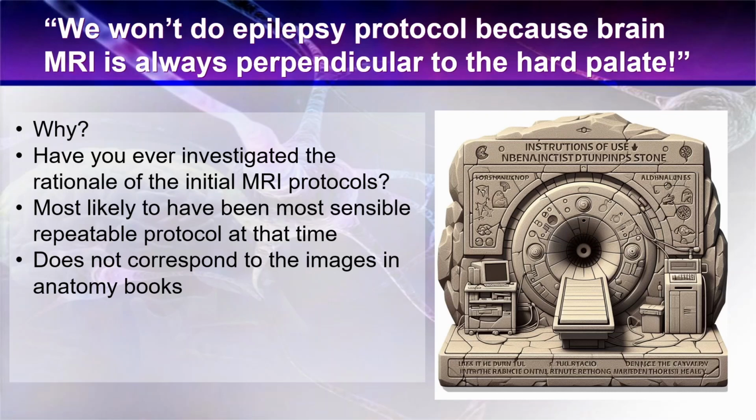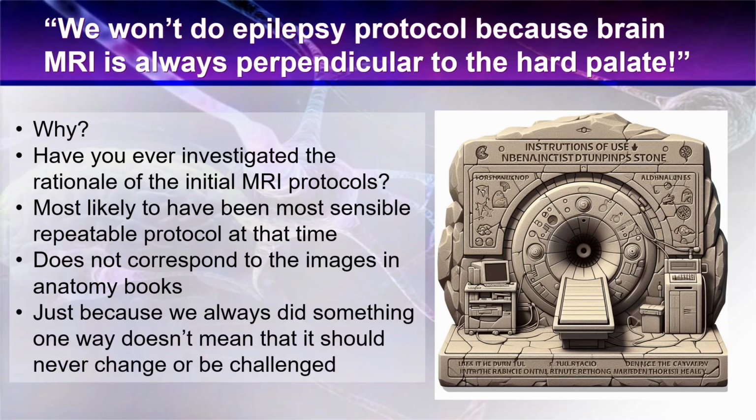And it is important to have a repeatable protocol. But I would argue that just because you've always done something one way doesn't mean that it should never change or be challenged. And these images are good for looking at anatomy, and I'll show you some more examples later.